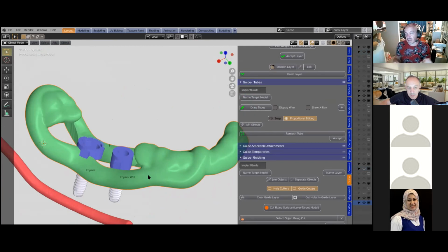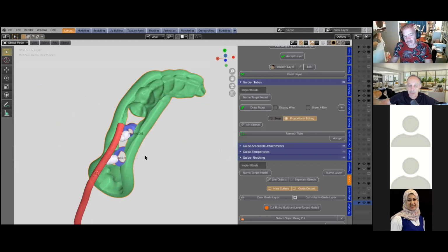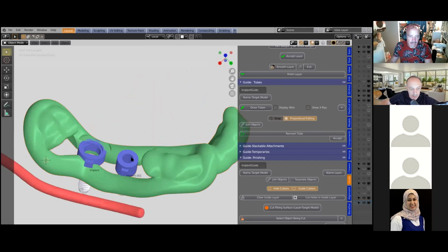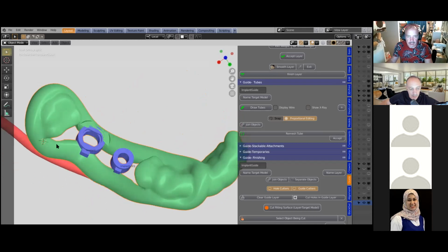But every now and then you can win the lotto, and you've got one vertex out of 1,000,000 touching another vertex out of 1,000,000, and these two vertices don't like each other, and it fails. And then we get a call, oh, this thing's failed, on TeamViewer. So you would just rescale it or remesh it, would you? Correct, yeah.